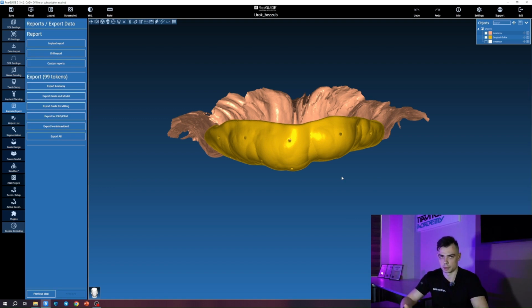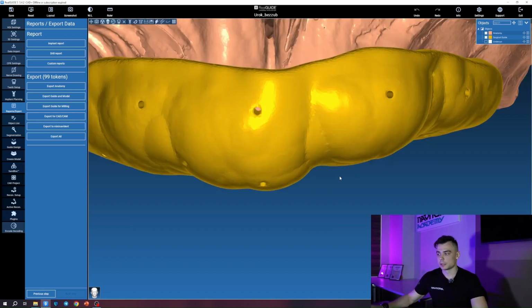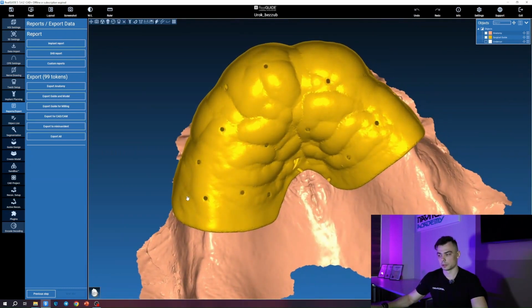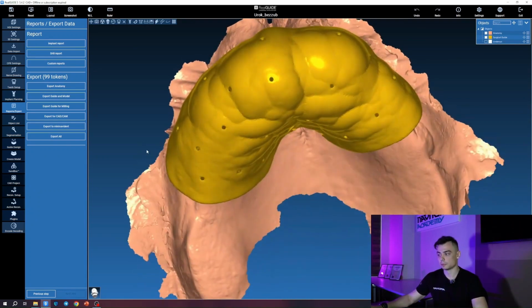In other words, this is needed simply to hold the template in place for about 15 seconds while the CT scan is being taken. Be sure to save this 3D file in your project, because we'll need it at the next stage when we directly align one with the other and model the surgical guide.